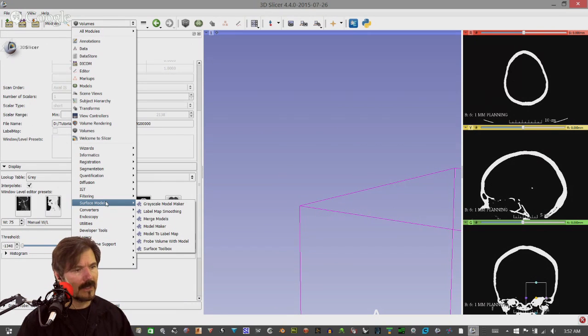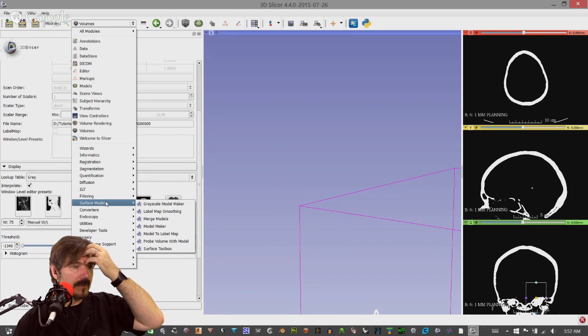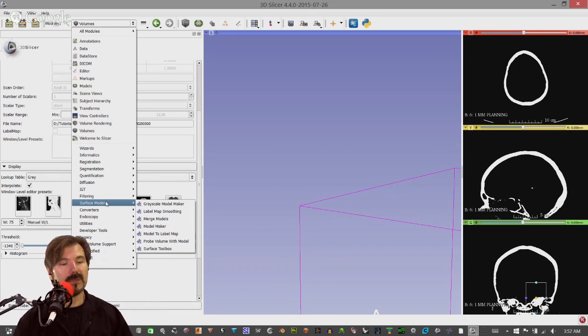Yeah, you'll have to download it, but essentially there's a tool that you can download, and there's a couple of them. What it will do is segment out just the brain, remove the skull, and then you can obviously clean that up to create a model. I didn't download it, but it is a free plugin to work with.